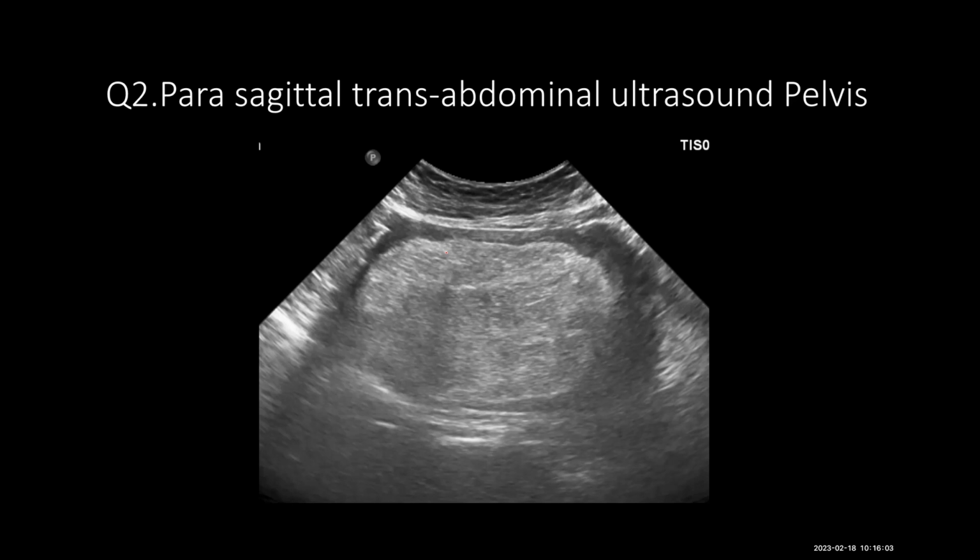I would like to see its relation with the ovary, as well as with the fallopian tubes, to determine the exact extent of this lesion, as well as the nature of this lesion. Considering this high echogenicity, my primary differential can be a large hemorrhagic cyst. Since it does not have any fluid levels within it, and I cannot appreciate any calcific nodule, other differentials would include teratoma.